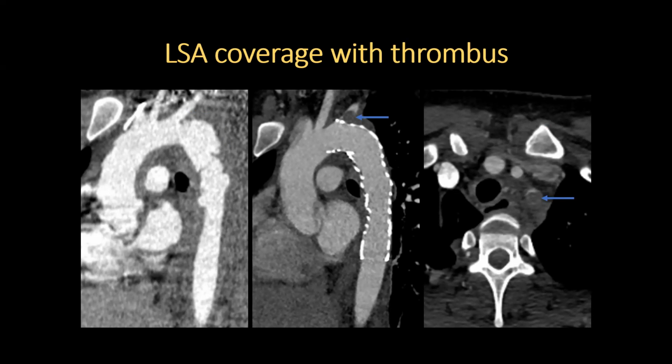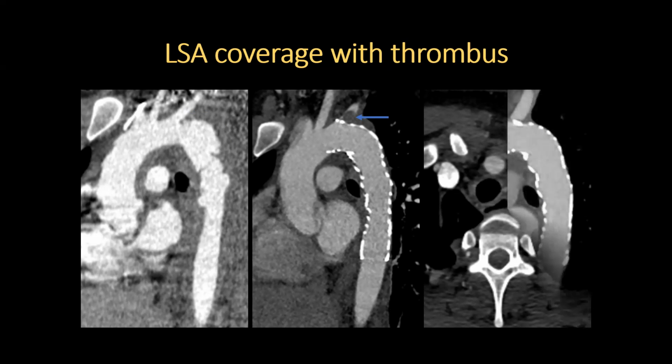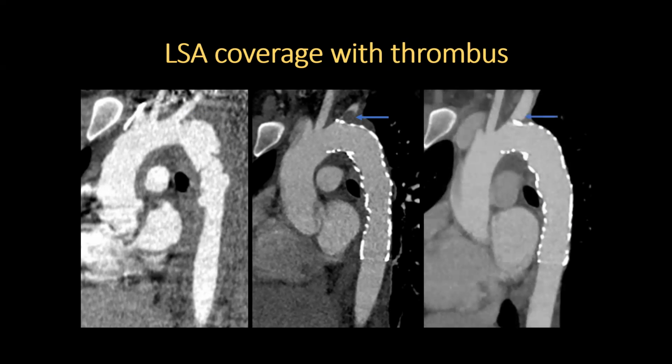Is this something to be concerned about? Most patients tolerate left subclavian artery occlusion without consequence. For example, in this case, the thrombus resolved on follow-up imaging. It is still important to mention left subclavian artery partial or complete occlusion if present.